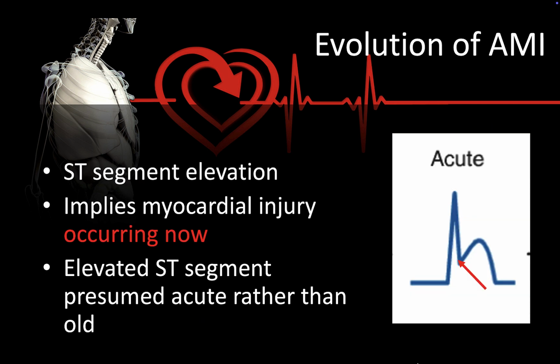Acute changes show up with ST elevation, as we already mentioned. This implies that there is myocardial injury occurring right now. That elevated ST segment is presumed to be acute rather than any old cardiac event or old cardiac damage.